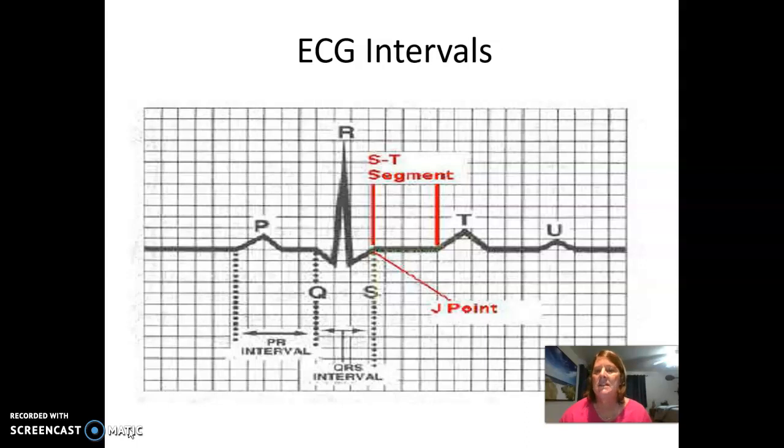And at most facilities that you will work at, if you're working with monitored patients, especially if they're a continuously monitored patient like on a telemetry floor or on an intensive care unit, it is actually a policy that every shift a strip will be run and you will measure all interval measurements.